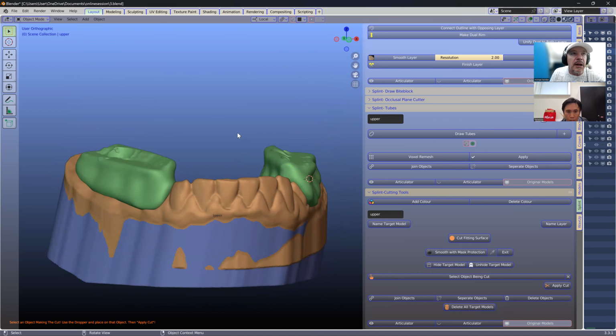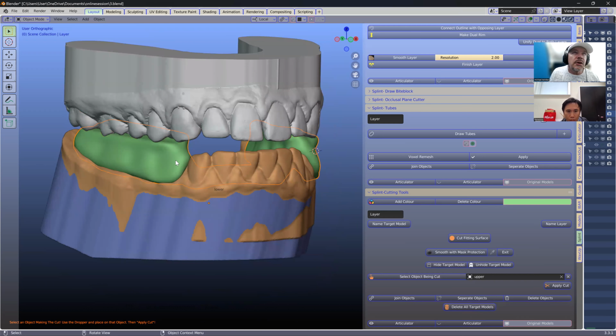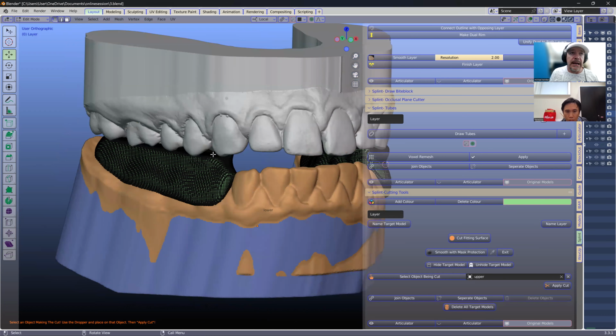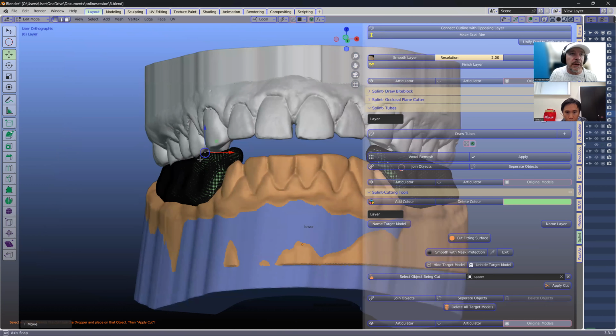If you find you don't have enough indent, just do what we did beforehand. We'll go into the tab, take this proportional editing on, use the G key, and then just move it up a little bit, or move it across a bit.